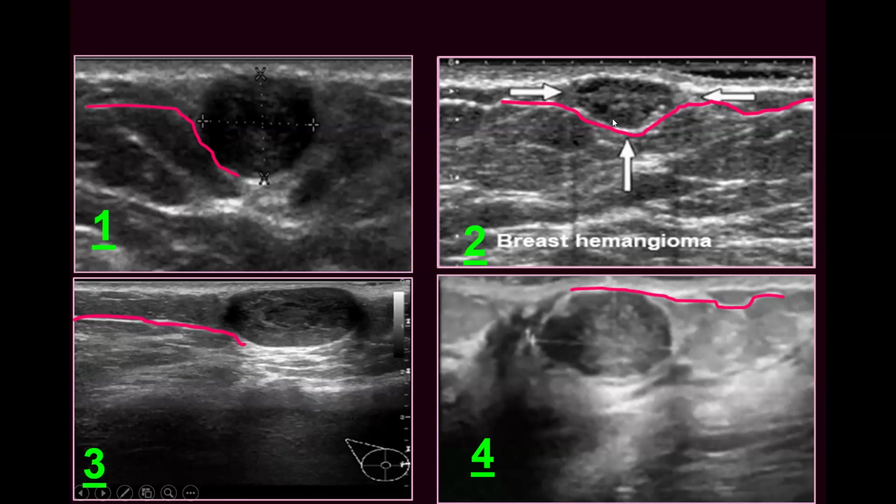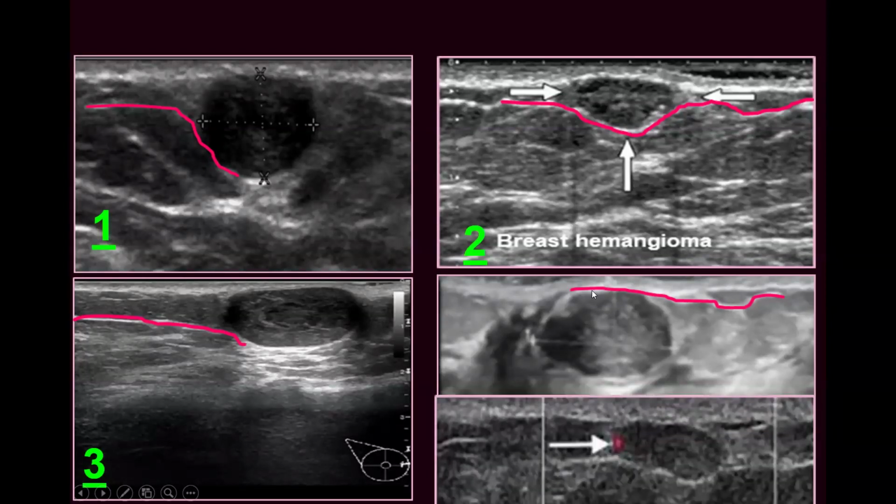And this is a hemangioma within the pre-mammary zone also, and you see it affecting the adjacent skin here, pushing the superficial layer posteriorly, though hemangioma can even arise within the mammary zone, but this arises in the pre-mammary zone. Again, this one is the epidermal inclusion cyst pushing the fascia posteriorly, while this was a fibroadenoma pushing the fascia anteriorly.